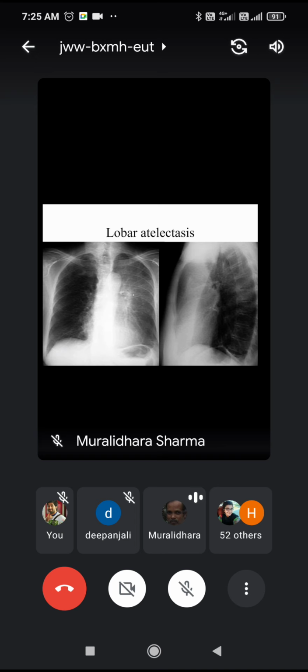So you may consider this as only fibrous bands, and within this fibrous band area, you can find this dilatation. In the previous example of fibrosis also, we referred to a similar issue. When a fibrous band occurs, it also can result in small, minor atelectasis changes, which is confirmed by the lateral view X-ray. In the lateral view X-ray, you can see this area of fibrosis and the presence of air shadows within. So it's a common phenomenon.